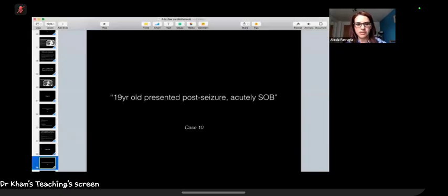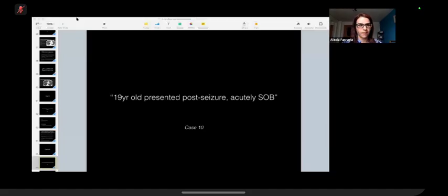Okay, so this is your history. 19-year-old who presented after a seizure, acutely short of breath. Clinicians were very, very concerned about him. So whenever you're ready, just describe what you see.